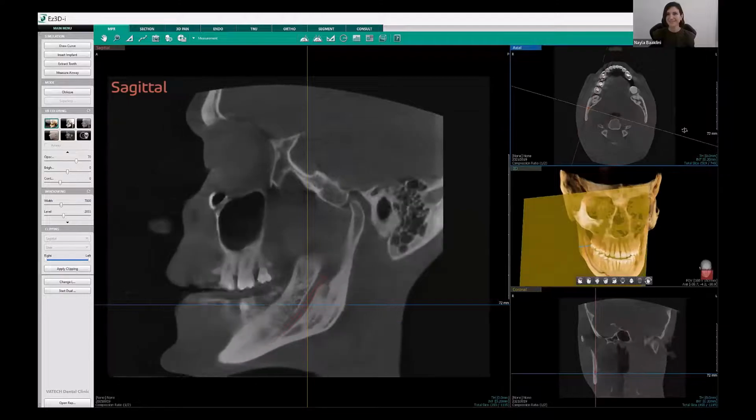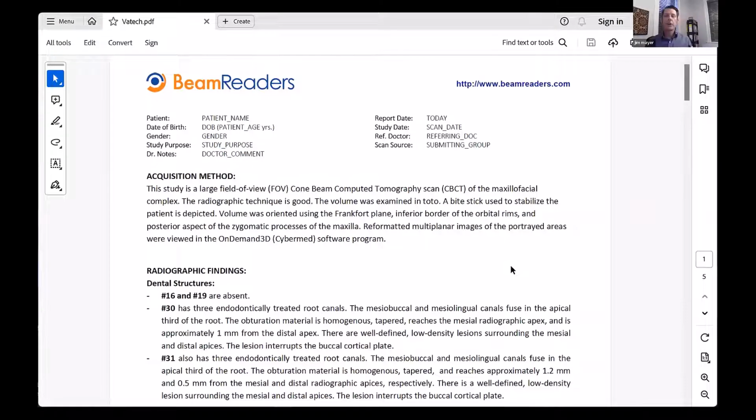Of course. All right, so we've just done our anatomical review of a data set, and Doctor, you actually took that same data set and did a radiology read on it, and here's the report. Let's go ahead and take everybody through what those reports look like, what we can expect, and the methodology and the overview of the report itself.